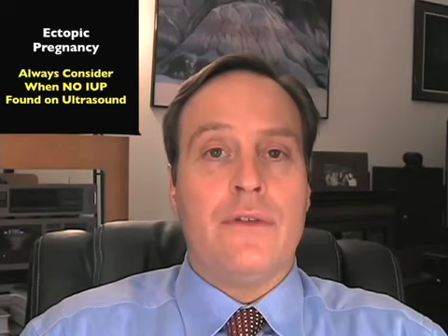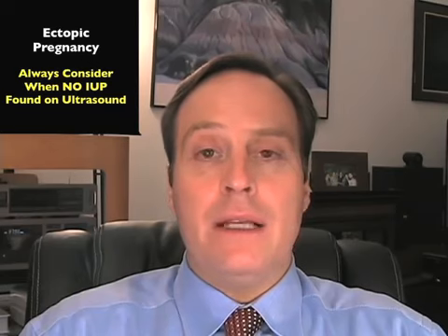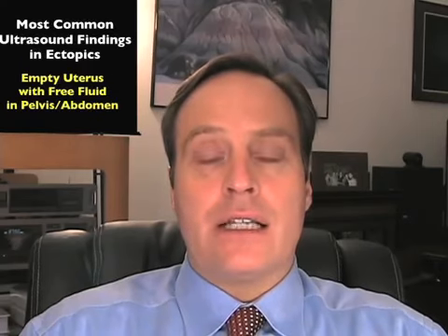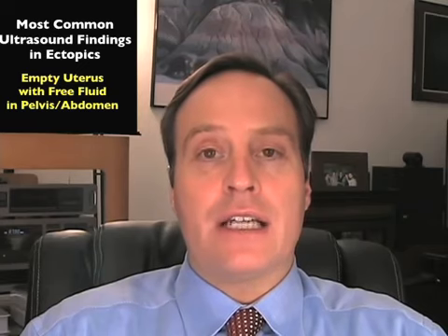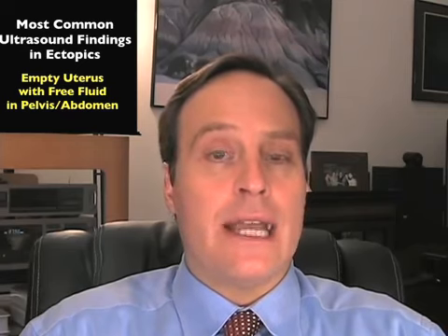So now that we've discussed some important facts and figures about ectopic pregnancy, let's describe what we're actually looking for on the transvaginal sonogram. We must consider ectopic pregnancy, as we talked about earlier, when we fail to see an intrauterine pregnancy with a relatively elevated beta-HCG. Now, if we look at the adnexa, we may be lucky enough to actually see the ectopic pregnancy as visualized by a yolk sac or fetal pole within the tubal ring. But many times we're not going to see this, and we're going to see findings suggestive of ectopic pregnancy, such as free fluid within the pelvic cul-de-sac or within the abdomen.